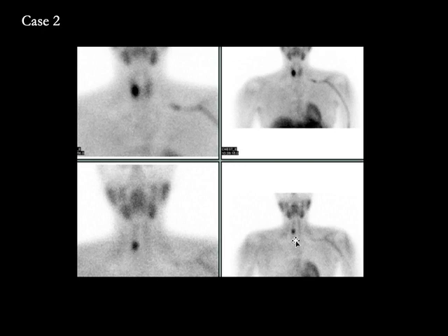So this is telling the surgeon that they should do a limited dissection at the inferior pole of the right lobe of thyroid and resect a parathyroid adenoma. So that's the utility of doing the parathyroid scintigraphy and identifying the location of a parathyroid adenoma. Otherwise, the surgeons used to do bilateral neck explorations trying to find the parathyroid adenoma.